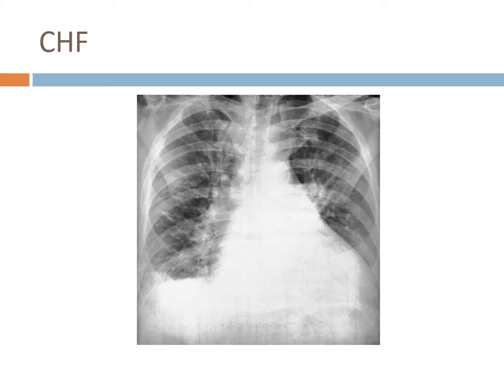So generally the normal chest image shows the pulmonary blood vessels most prominent in the lower lobes. When left side heart failure, or CHF, happens, this increases venous pressure, and the increased pressure then distends the upper lobe vessels that would otherwise carry very little blood. Okay, so when you have this engorgement of these vessels, then you're able to see them. They're more prominent on the X-ray when you have that extra fluid. Okay, so this will be on 207 in your textbook.